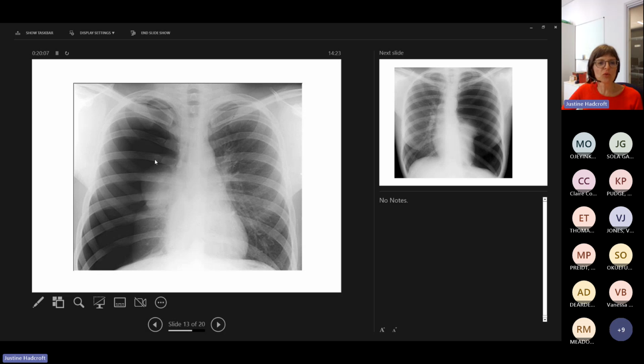And when we're talking about lung markings, I think this is a good chest X-ray to explain what lung markings are. You see this blackness here and think, oh, that's a bit strange. Compare it with this side. Can you see all these little white lines here? And it's quite grey all the way out, isn't it? These lines are the blood vessels there, and it's grey all the way to the very edge. So these are lung markings, and here you can see there are no lung markings. So this is a large right pneumothorax. That will probably need a chest drain, I would imagine.